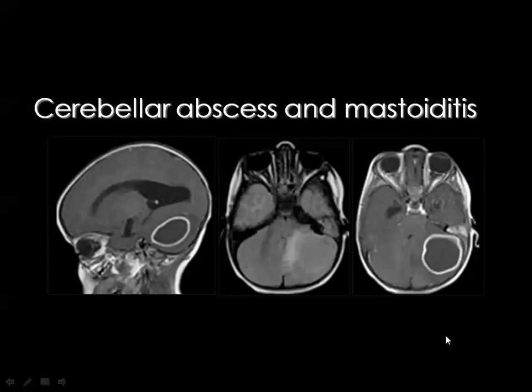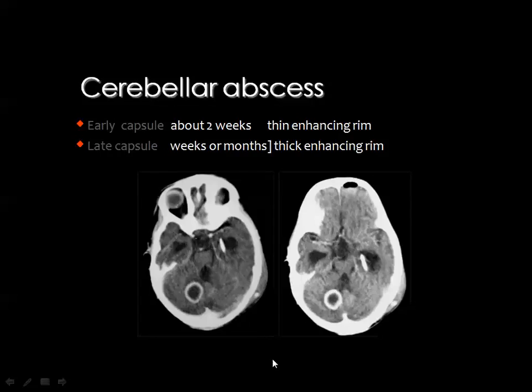And cerebellar abscesses are usually the sequelae of ear infection, and it is a good policy in the exams, in particular if you see a cerebellar abscess, to look at the ipsilateral mastoid and the middle ear, searching for an inflammatory lesion like this one, which is evident here.